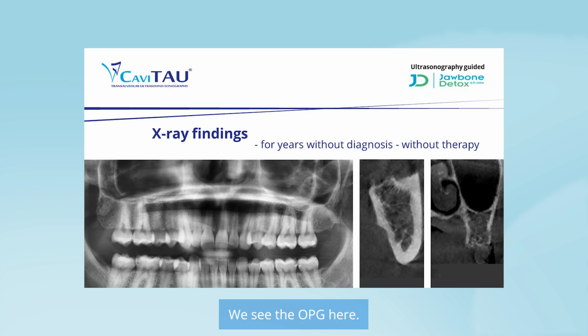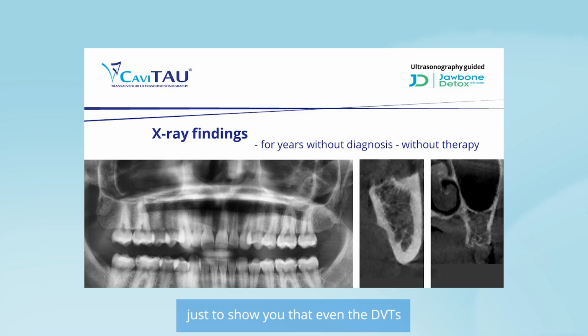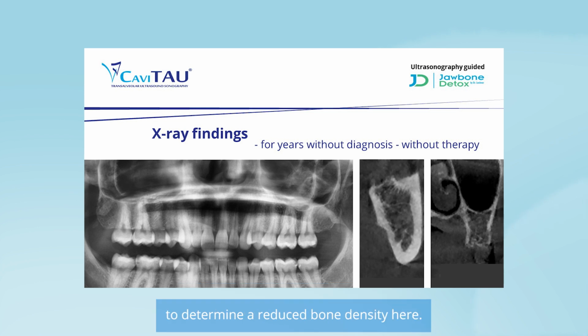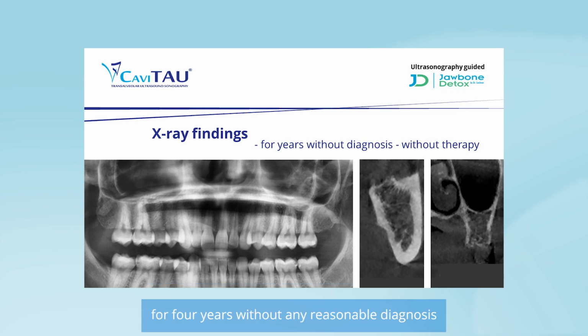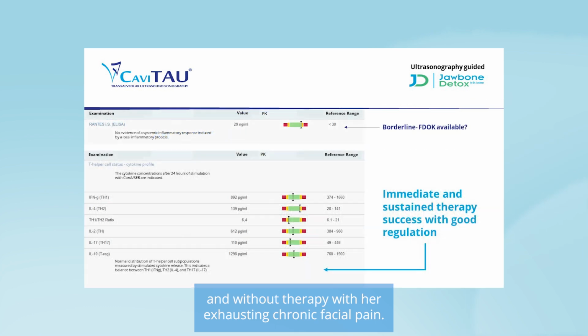We see the OPG here. I have drawn in the DVTs on the right, the slices of the DVTs, just to show you that even the DVTs would require at least a particularly benevolent interpretation to determine a reduced bone density here. With these X-ray findings, the patient has been running around for 4 years without any reasonable diagnosis and without therapy with her exhausting chronic facial pain.